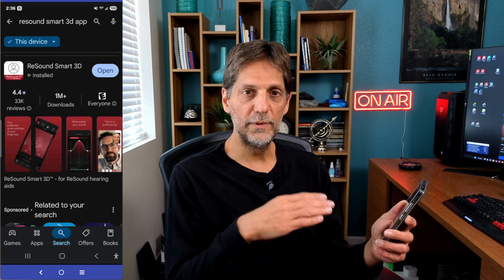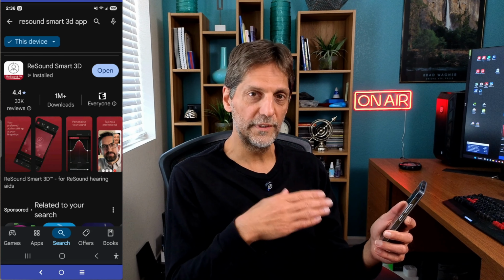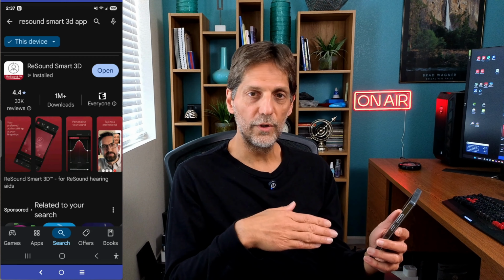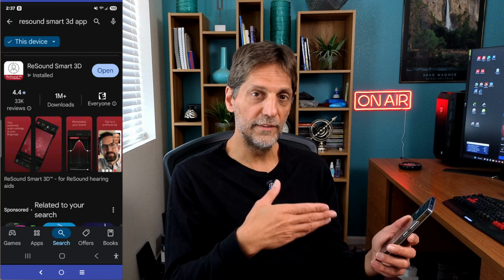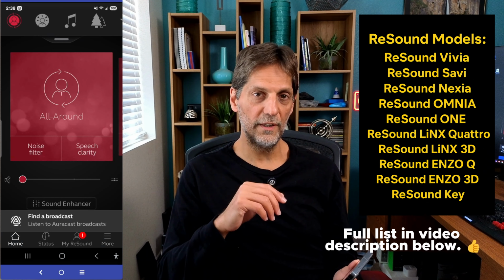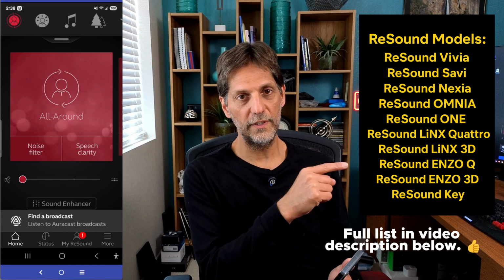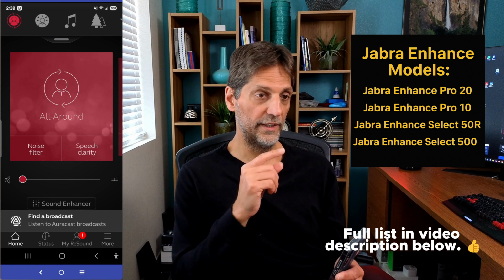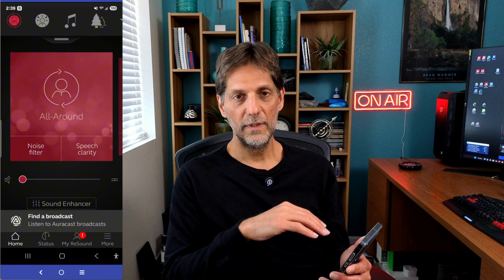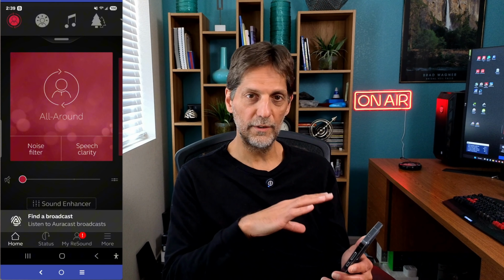Many of you asked me to do a tutorial of the ReSound Smart 3D app. I've done a similar tutorial to other applications, and since you'll ask, I'll do this one as well. Whether you have one of the ReSound hearing aids that you can see on the list over here, or the Jabra hearing aids, or the Beltone hearing aids as well, you are all using the same ReSound application.